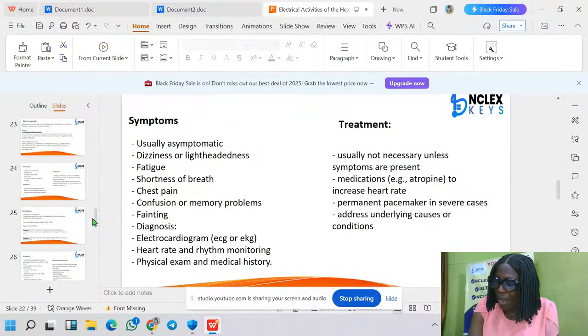So look at the PR. Is it the PR I explained to you? Is it the normal PR hovering 1 to 3, 3 to 5 boxes? Is that the normal PR? You are not responding. Oh, okay. Count out 30 boxes from the strip. Why are you counting out 30 boxes? This strip is 30 now.